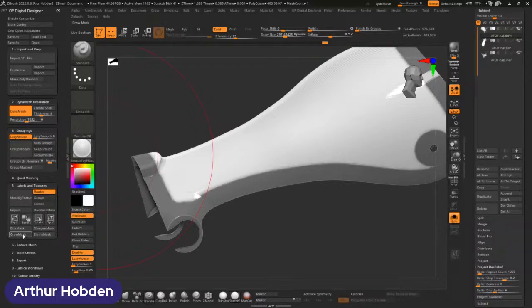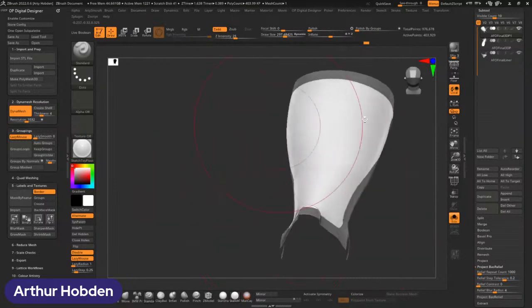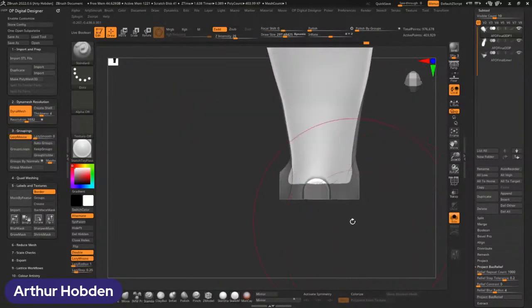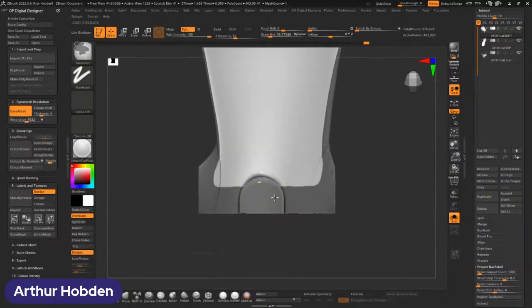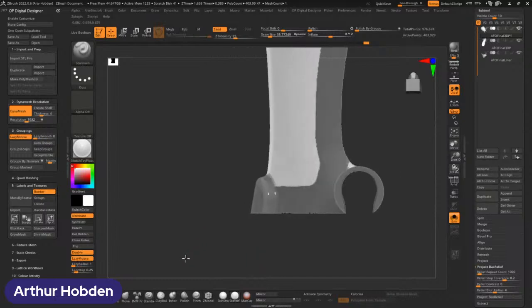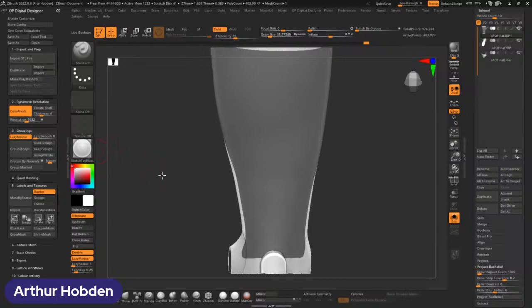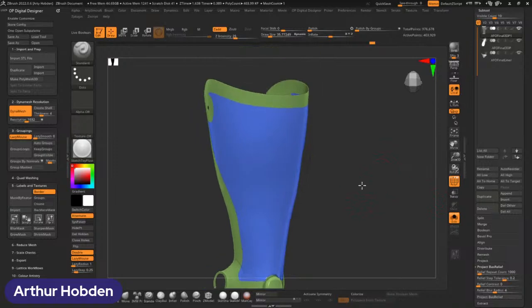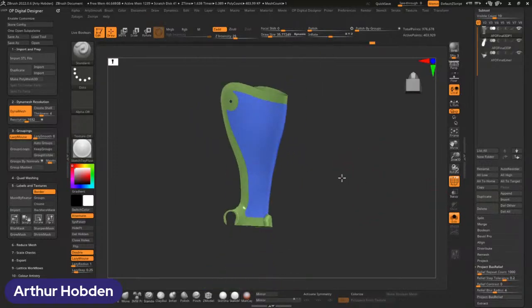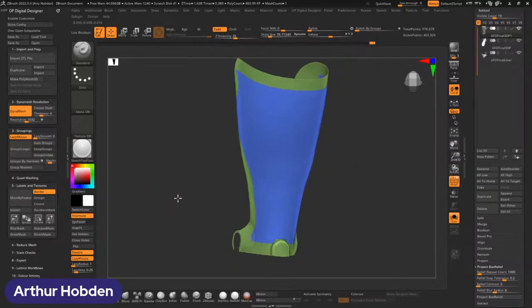So by doing something like this and just slowly growing it, we can very quickly create a masked window. And I can go look at it from here too, and I can use my brush to maybe add that stop as well, just so that's not in there. So something like that, hey? And so once we make that group, let's make a new group from this. So group masked again. Right, so turn off our lines, turn on our fill. So there's a new group we've made for ourselves, right? That's a great group to apply a texture to and also maintain the strength of our trim lines.